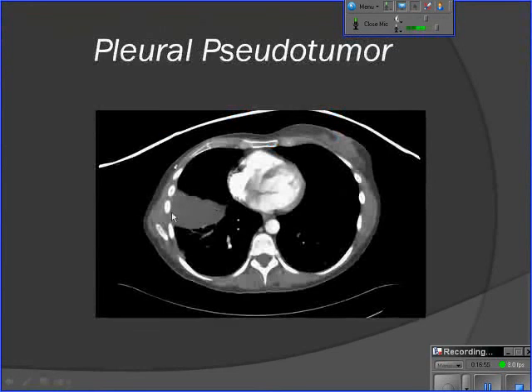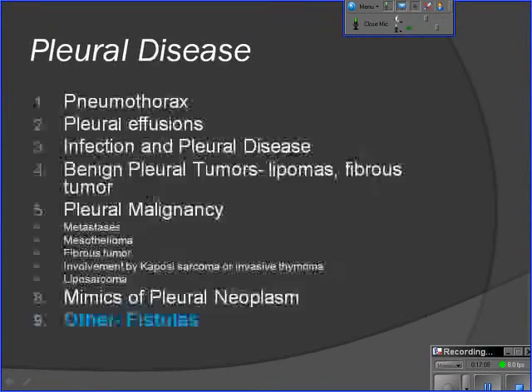And this is just an example from our institution. So in this patient, there was pleural fluid that was tracking through the fissure. And I think it would be more impressive on a chest radiograph. However, this patient didn't have any at this time point.